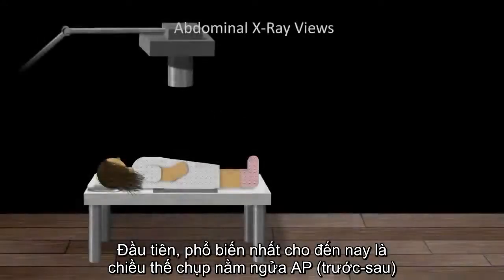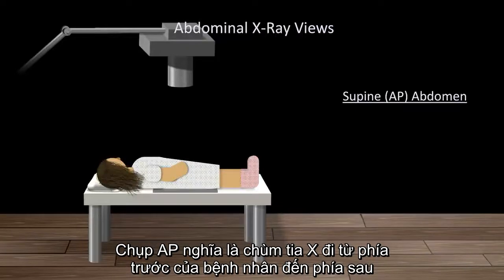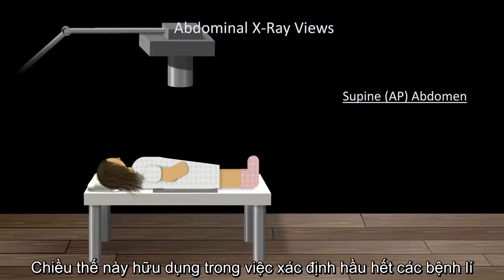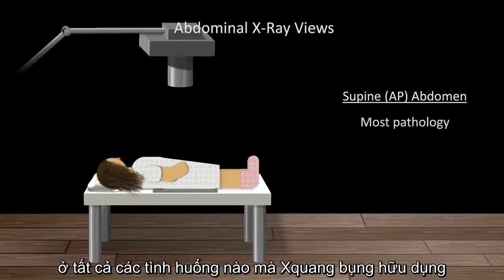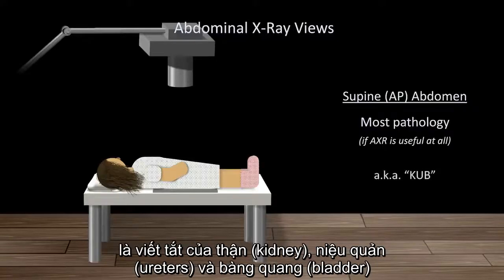Now, let's talk views. There are three main ones. The first is by far the most common, the supine AP view. AP meaning that the X-ray beam travels from the anterior side of the patient to the posterior side. This view is useful for identifying most pathology, that is, in situations where abdominal X-rays are useful at all. The term supine AP view is often used interchangeably with the acronym KUB, which stands for kidneys, ureters, and bladder.